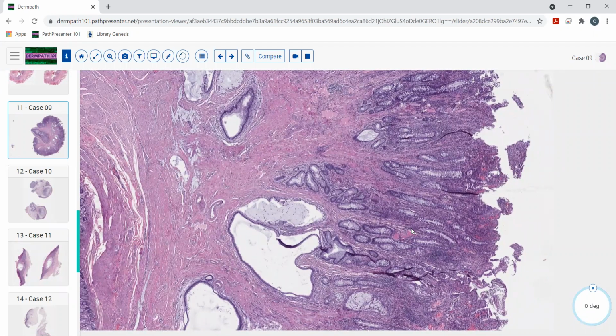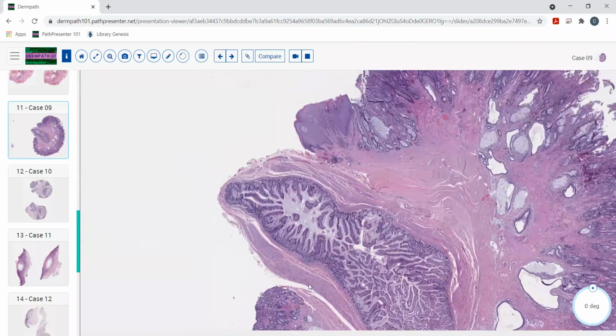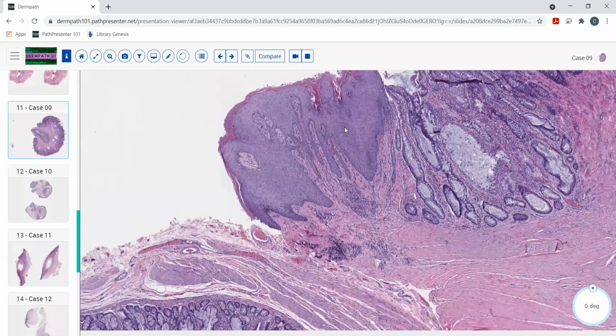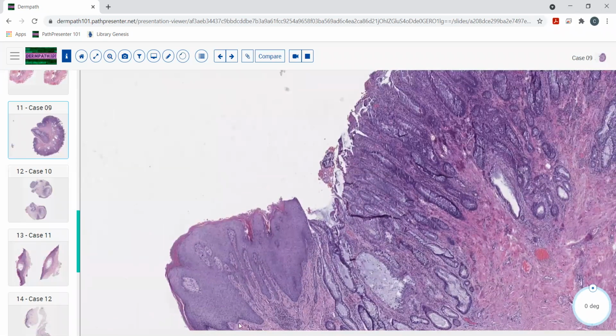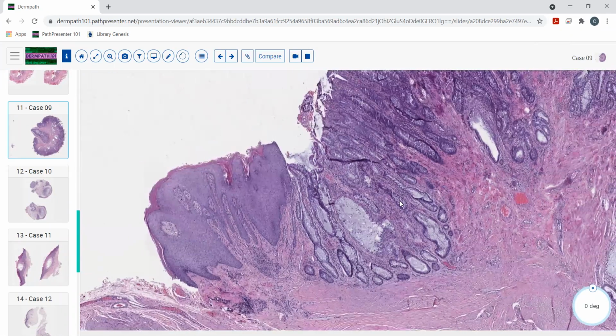Okay, now you don't probably need to know much about that, but if you see something like this on the board, and it looks kind of like it's GI epithelium, and notice how over here, it's contiguous to stratified squamous epithelium. So just think about where this might be occurring. So you've got, say, normal umbilicus tissue, and then you've got this red or eroded area with this tissue that is recapitulating the gastrointestinal tract epithelium. This is kind of what you can see at the site of things like when people have colostomies and things of that nature. You can see it's kind of where the GI epithelium and the stratified squamous epithelium join together.